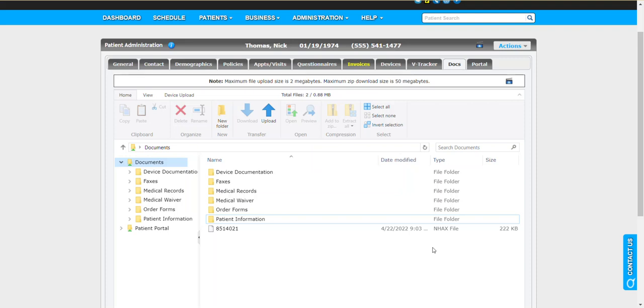Okay, so throughout this process, what we've done is we've backed up the Noah session. We've deleted the sessions in this patient's CounselEAR Noah Cloud area, which enables us then to move forward and program devices. And then we have saved that Noah file from the desktop of your computer, wherever you have it, into their CounselEAR document section for later use.